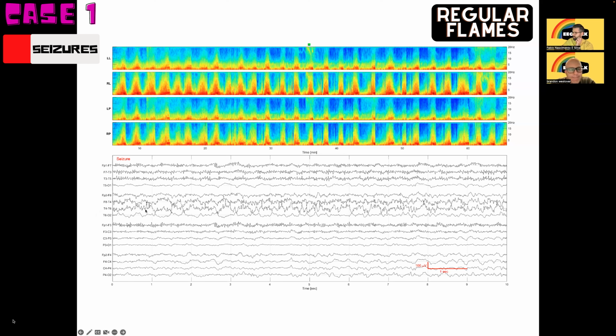It's hard to see the evolution just looking at 10 seconds. So maybe LPDs. You might call it right-sided LPDs. You maybe see a hint of evolution, seems to be speeding up near the end, but you can't really tell on this scale, whereas it's easy to tell on the spectrogram.